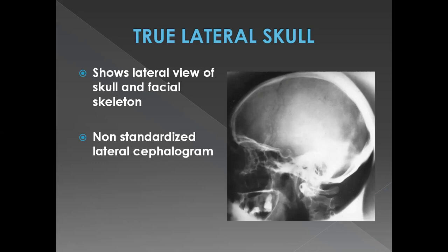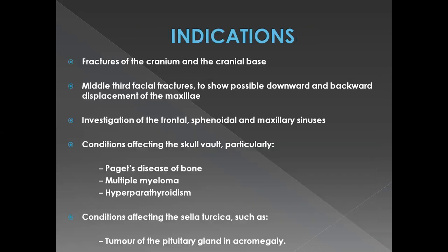So you really can't evaluate outcomes of your orthodontic treatment on such an X-ray. You will have to do a proper lateral ceph if you wanted to check the outcomes of orthodontic treatment. So it's basically a non-standardized lateral cephalogram, and it is indicated in fractures of the cranium, the cranial base, and mid-face fractures, if possible, to show the downward and backward displacement of the maxilla, which may produce premature posterior bite resulting in anterior open bite.